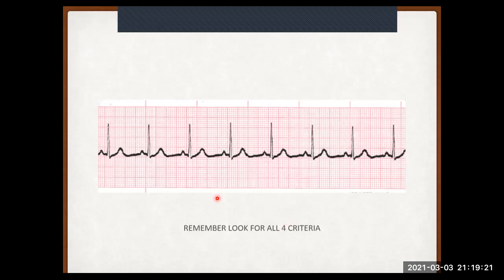So what you can do now is, if you want to try it yourself, pause the video now, try it out, and then you can listen to what I have to say. Okay, so let's look at our criteria.